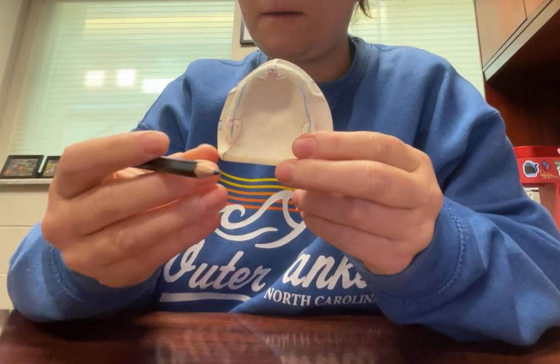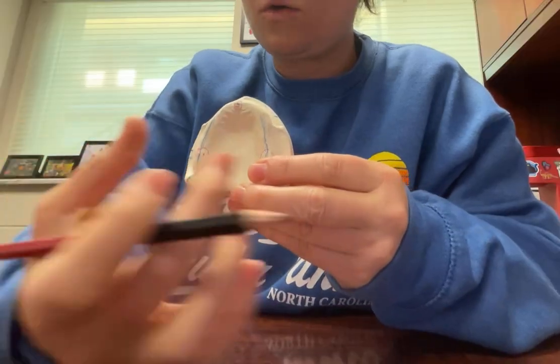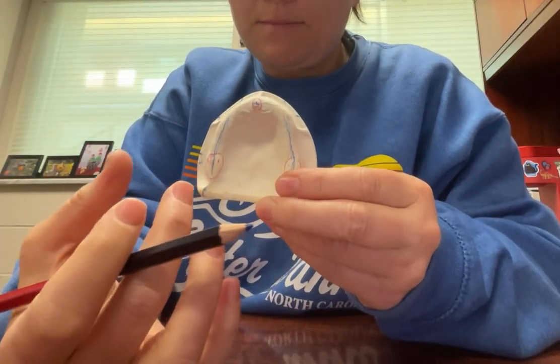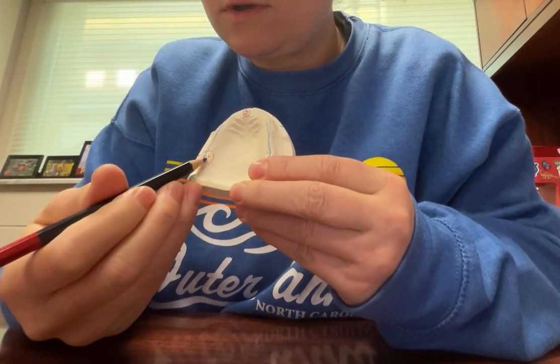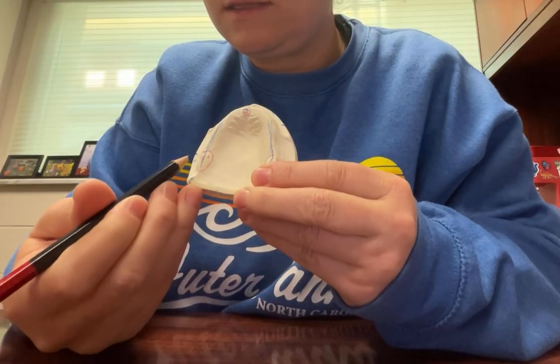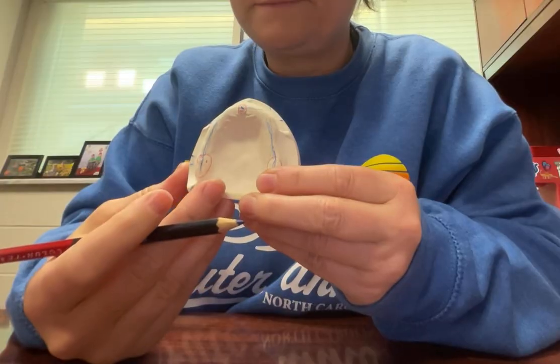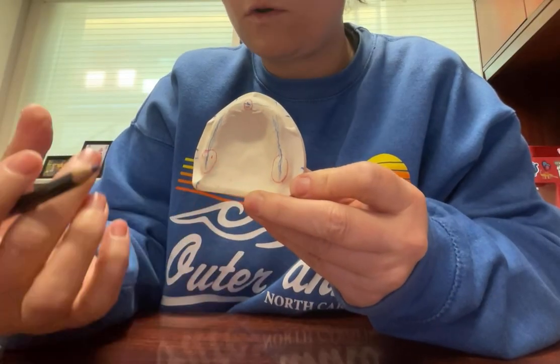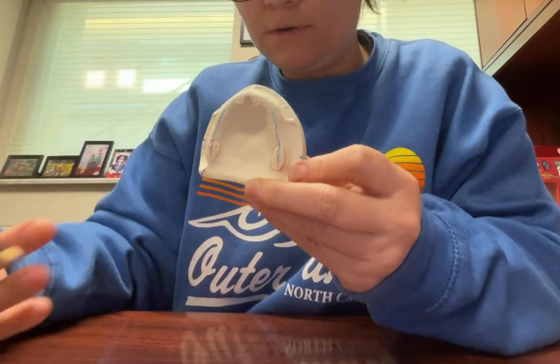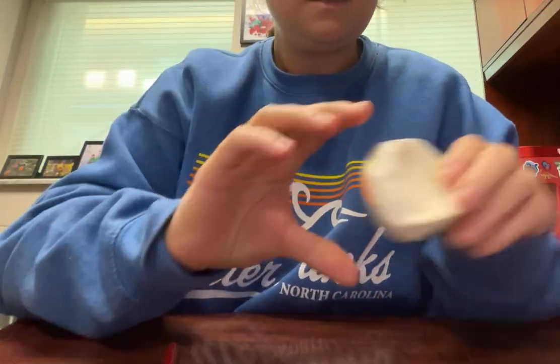And then this is going to dictate where your posterior wax rim is centered over the crest of the ridge. We want it to be very slightly buccal. So usually we'll have 2 to 3 millimeters on this side of the line and 6 to 7 millimeters on this side of the line. So slightly less lingual than buccal, if that makes sense. Less wax lingual and more wax on the buccal, because the maxillary teeth sit slightly buccal to the mandibular teeth in the posterior. So those are your lines, and that's what they mean.